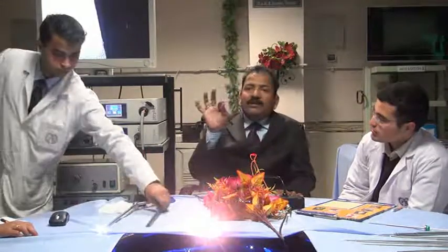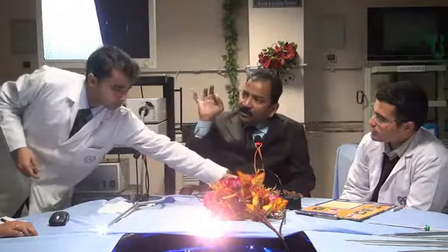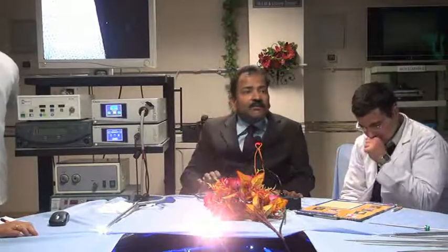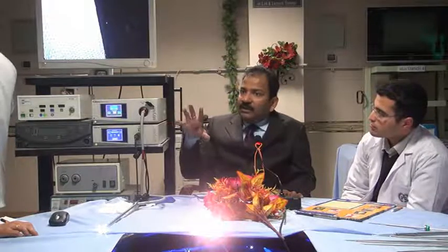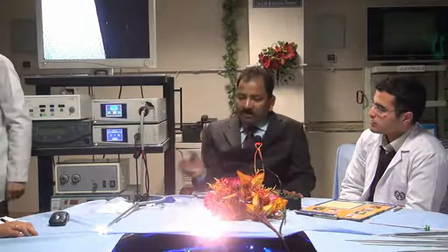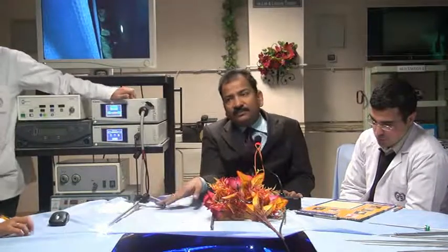So if you are using HD, the quality of your surgery should be good. Otherwise, if there is even a petechial hemorrhage, if your assistant is holding the peritoneum here and there, all those small spots will be visible. Sometimes those petechial hemorrhages are confused with endometriosis because of the good resolution. But because of HD quality, you can discriminate between red and brown. So the resolution of the image depends upon HD or SD. SD is standard definition, HD is high definition.